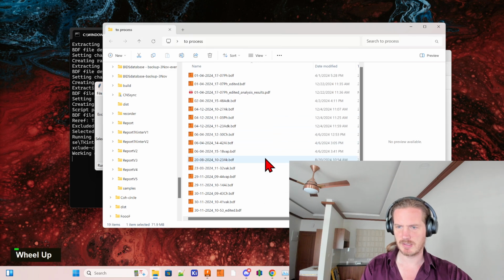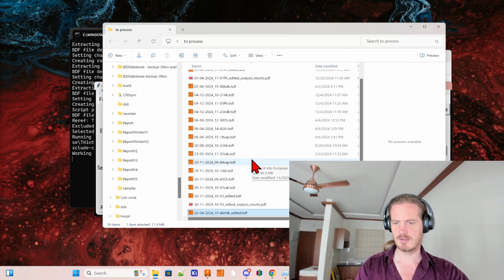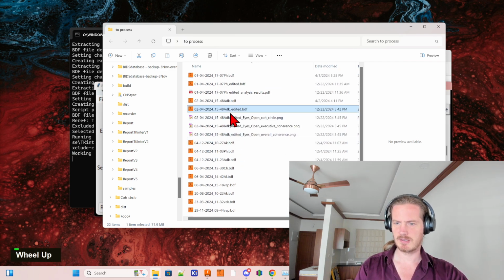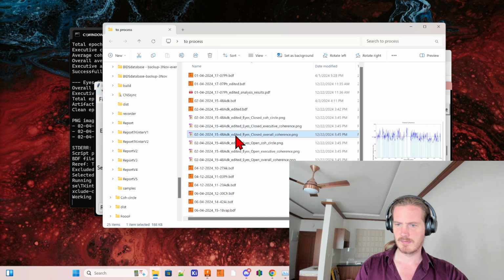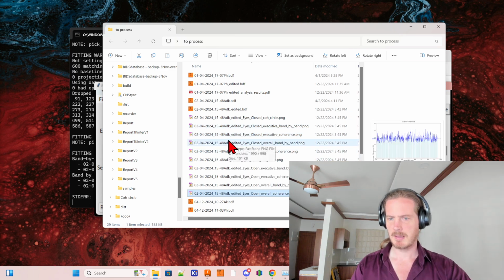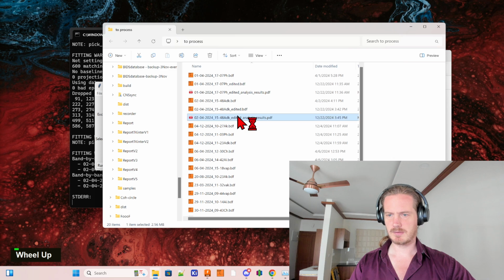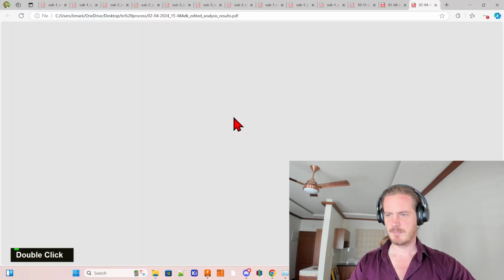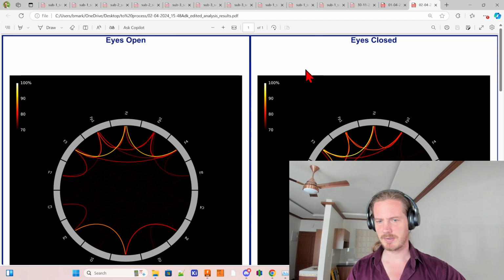Now again we'll see images appearing in this folder, and then at some point they disappear, and there will be a PDF file. There we go. This is the PDF file. And then we can see we have the eyes open and the eyes closed period.